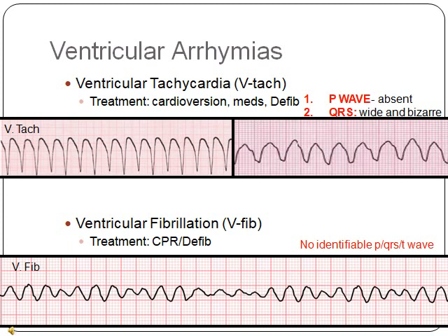Ventricular tachycardia lasting more than 30 seconds is really dangerous because it could lead to ventricular fibrillation. Ventricular fibrillation is the most lethal of them all. It's the same thing as the AFib, it's just in the ventricles instead of the atria.